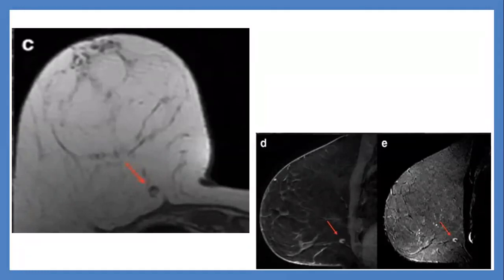When the fat is preserved, the fatty hilum will be seen; when the fat is suppressed, the fatty hilum will be suppressed. Also smooth, circumscribed, oval or lentiform, and less than 1 centimeter. Small, commonly upper outer, but can be seen anywhere.